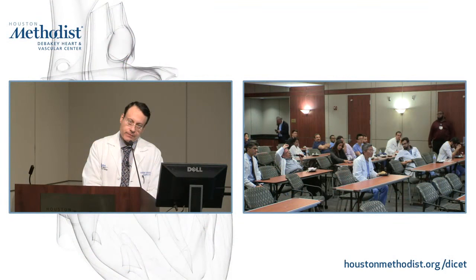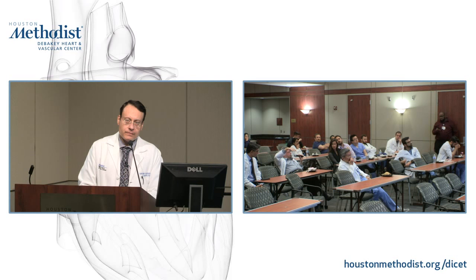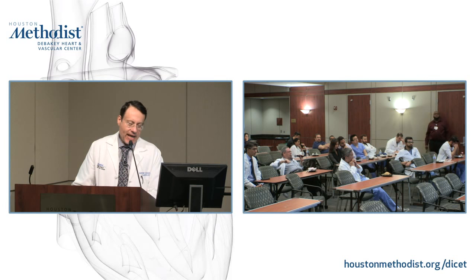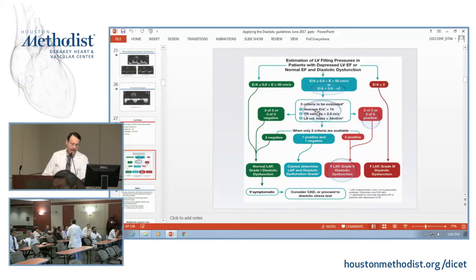One comment, Sherif: in some of these patients where I cannot assess diastolic function because of the signals, I have taken the position that if there are elements on the 2D to suggest heart disease, and the LA is enlarged and the PA pressure is up, I will go for it. Even if the signals are poor. That is okay, and it goes with the guidelines, because you will have here two abnormal values, the TR and the LA volume.